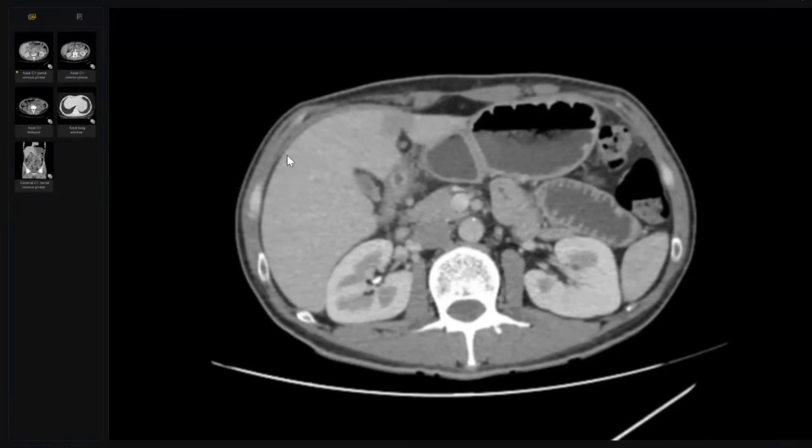No, it's not an abscess. There is no significant peripheral enhancement on both contrast studies. Okay, so what is the name of this lesion? I think this is just fatty infiltration. No, this is a pseudo lesion, my colleagues. What does it mean?